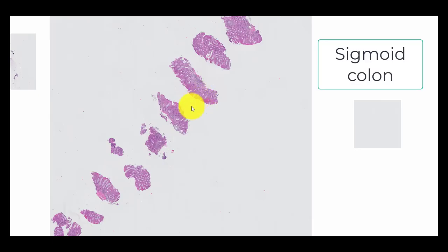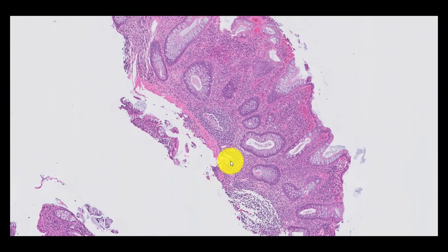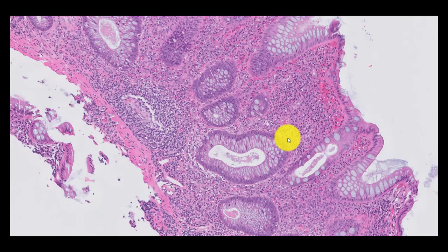And here are these biopsies from the sigmoid colon. And for the sigmoid colon, this appears blue, not only blue, but also uniformly blue because every fragment looks blue. Let's start by looking at this specific fragment. One is, of course, we have decided it looks blue, and it's blue because there's a ton of inflammation in the lamina propria, pushing the crypts apart.